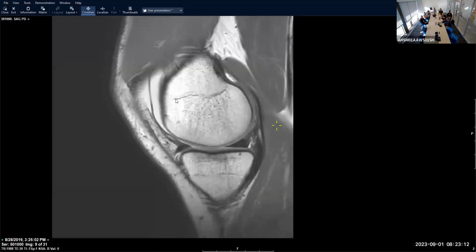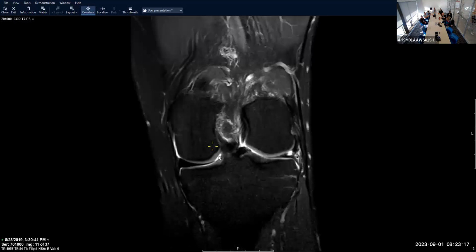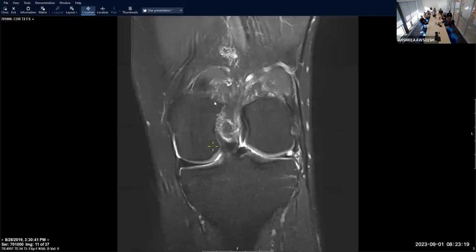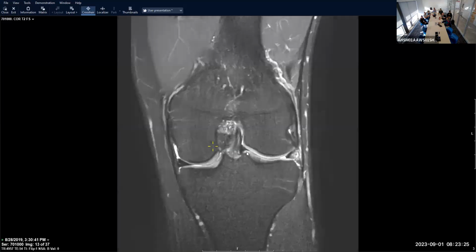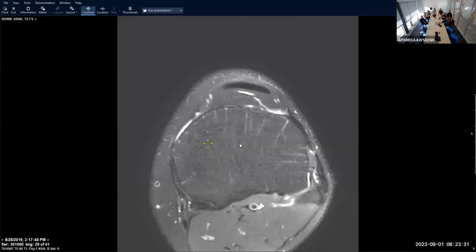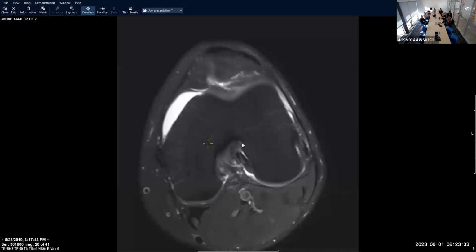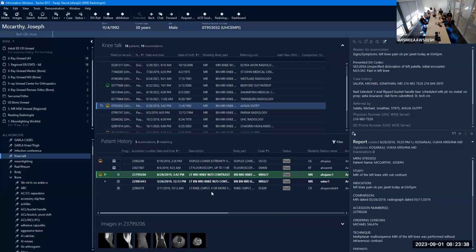A little bit of joint effusion. It looks like it's not an acute injury, something maybe they've been walking around with, not a lot of soft tissue edema. Everything else looks fine, right? It's just that the meniscus looks terrible, and you can kind of see that fragment here again in the intercondylar region. But no MCL sprains, no LCL sprains, ACL looks good, there's no bone marrow edema. Usually you're going to have an acute traumatic episode when you have a bucket handle tear, nobody's walking around. So I don't know, he's probably just had some delay before his MRI.